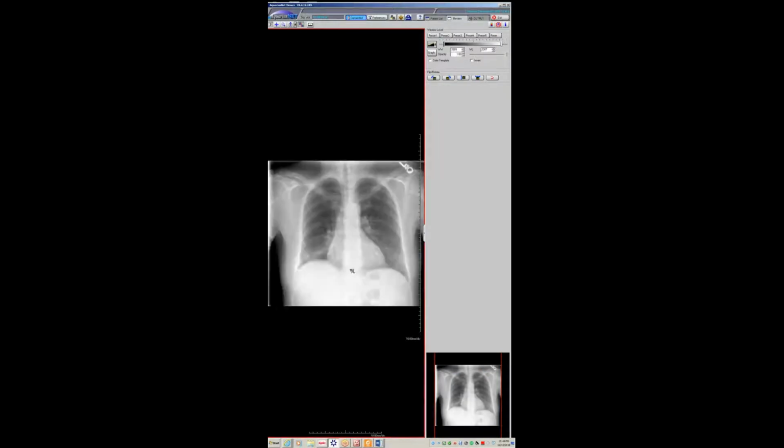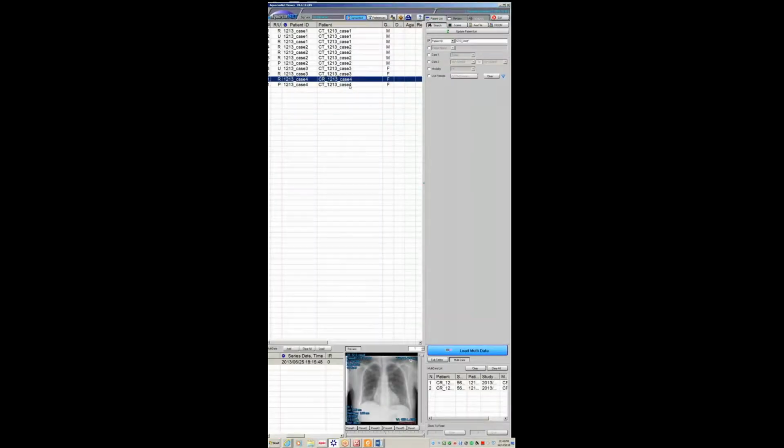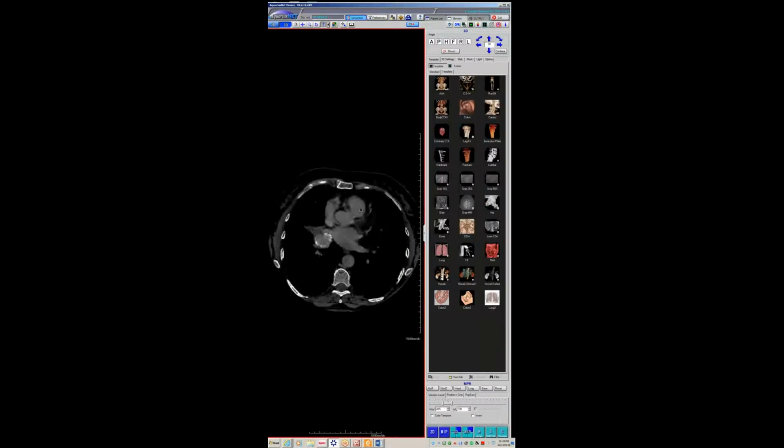Is it only taking out the lateral segment of the right middle lobe? So here it is. Because you can still see the right heart border, but you see that little band of atelectasis there. It's funny, I do have non-contrast, but I thought non-contrast wasn't interesting, so I'll just include the contrast. But I'll go back and download it and send it over.